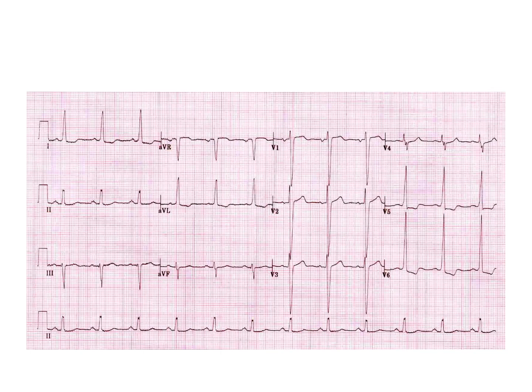Let's look at this one and we'll add tests for hypertrophy and block. Lead 1 is positive, electricity is going leftwards. AVL is more positive than 2, so it's going left and up. AVF is almost isoelectric, so we know electricity is going now leftwards and just slightly above the horizon. And in 3D, V5, V6 strongly positive, V1, V2 strongly negative. So again, left dominant axis in both 2D and 3D, so normal.